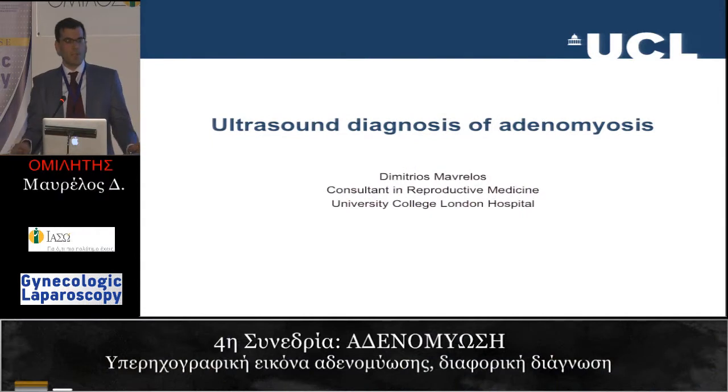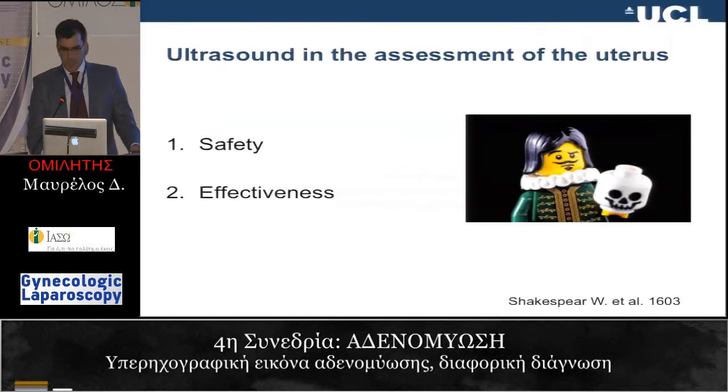So, ultrasound and adenomyosis. Adenomyosis is a relatively new concept in the field of transvaginal ultrasound. In the last few years, we have become better at diagnosing it, and we have moved on from the mere diagnosis to something a little bit more advanced. And why is it important to achieve the diagnosis?